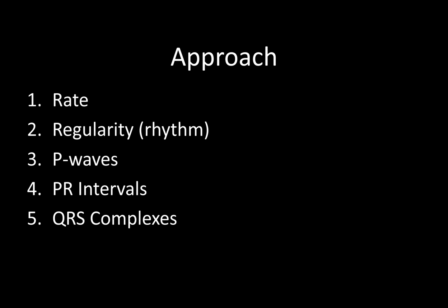So there's a couple different methods you can use to approach an EKG strip to break it apart and figure out what all the pieces are. This is essentially what I was trained to do and the sequence that I use. Some of these things you just do simultaneously, and you can do more than one at once. But as you're learning and trying to get a feel for everything, I recommend starting with this sequence and then building from there.